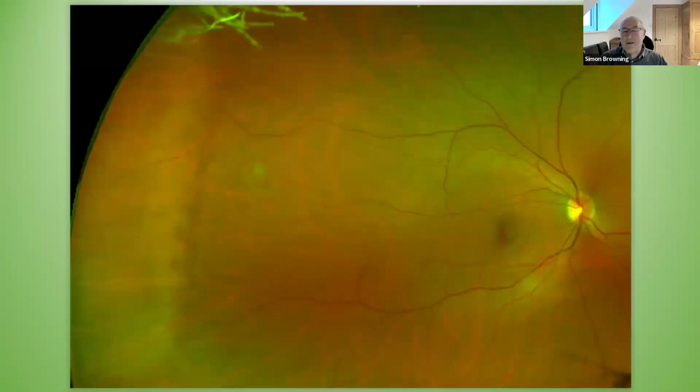And this is one of my favourite tufts of all time. You can see an area of white without pressure here, and you can see here this tuft. Now, the way I liken this is if you were to get a piece of cling film, wet it, and put it on a kitchen surface, and then pull up in the middle of that cling film, you'll get a tuft coming up in between your fingers, and it'll seal around the kitchen surface quite tight, and you'll end up pulling quite forcefully after a little while. And that's exactly what's going on here.